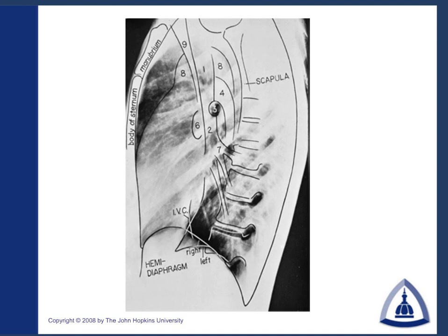So it's important in your mind to commit this to memory, because when you look at a lateral, at least when I started to look at them in the beginning, it was very difficult. But if you have this systematic process and this image committed to memory, it makes it much easier to remember.